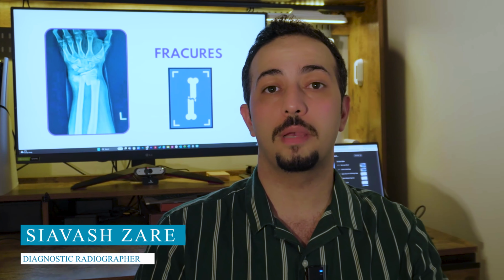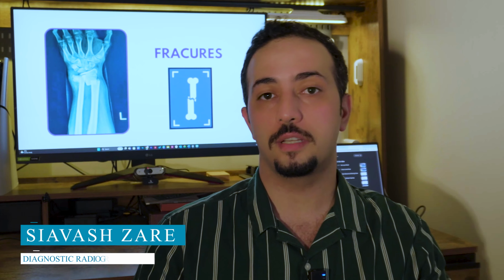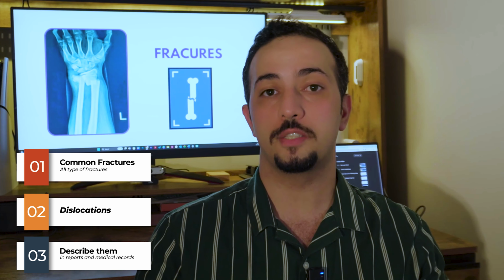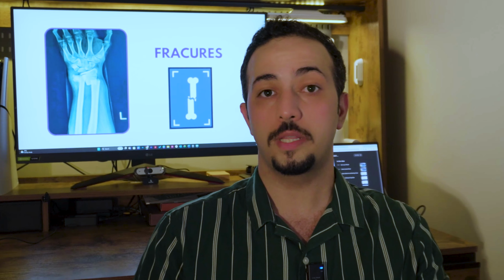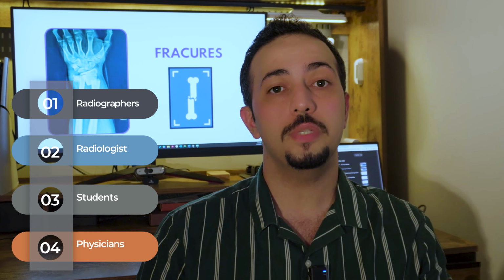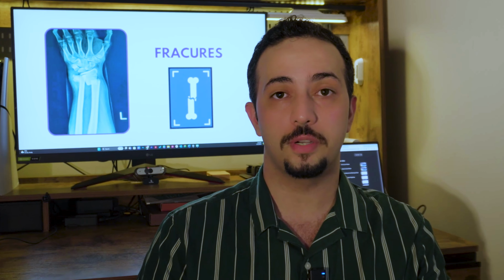Today we are talking about common fractures in plain X-rays. In this tutorial, we will cover key aspects of skeletal imaging, from identifying fractures and dislocations to how to describe them in your report or medical record. So whether you're a seasoned radiographer or radiologist or even a student eager to learn, let's dive into this journey into skeletal imaging. Let's get started.